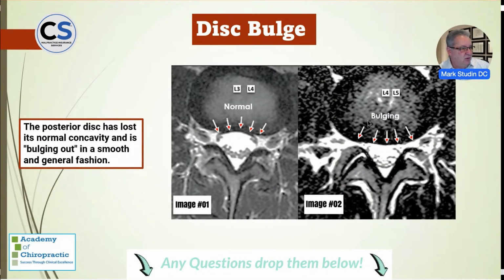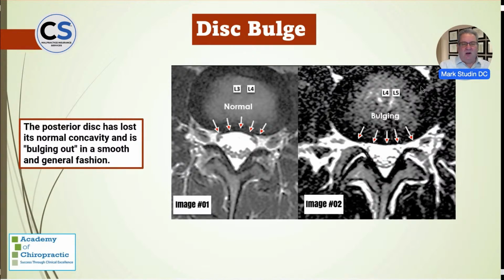Now, again, let's just do a little bit of anatomy. Here's your disc, and you can see the high intensity zone, HIZ, which is the nucleus pulposus, and the low intensity zone or low signal, which is the annulus fibrosus. And you don't talk about lights, darks, you say high signal, low signal, and this is normal. What we also see here are your neural canals.